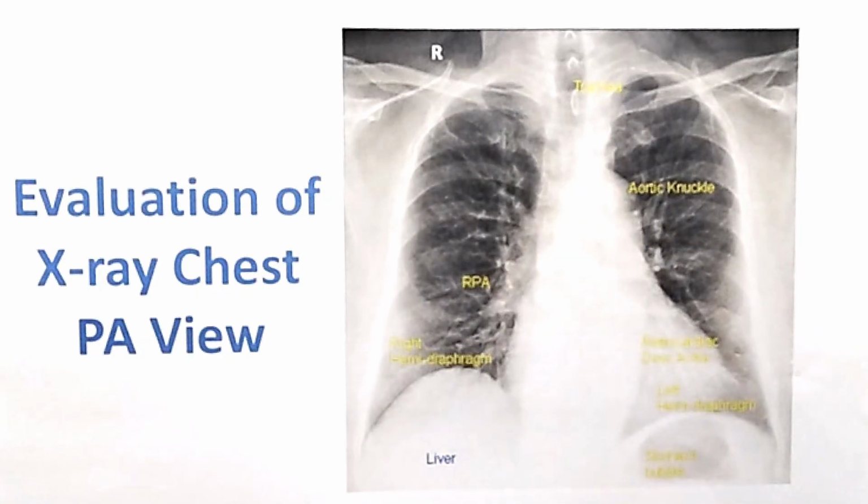Coming to air, always remember to look for air under the diaphragm in pneumoperitoneum. Person coming with chest pain could be having perforated peptic ulcer also. In olden days, it used to be common, and you will see air under the diaphragm. Here it is not there.